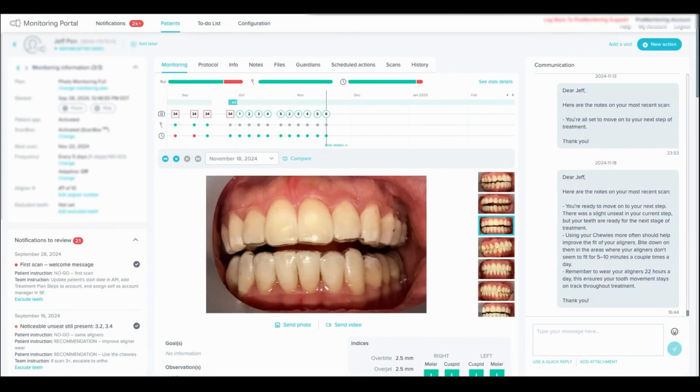Hope this video is helpful, and if you're an existing user, I hope some of these new features, particularly in our new comparison view, will give you that additional flexibility you're looking for to do a deep dive on your patient's treatment plans.